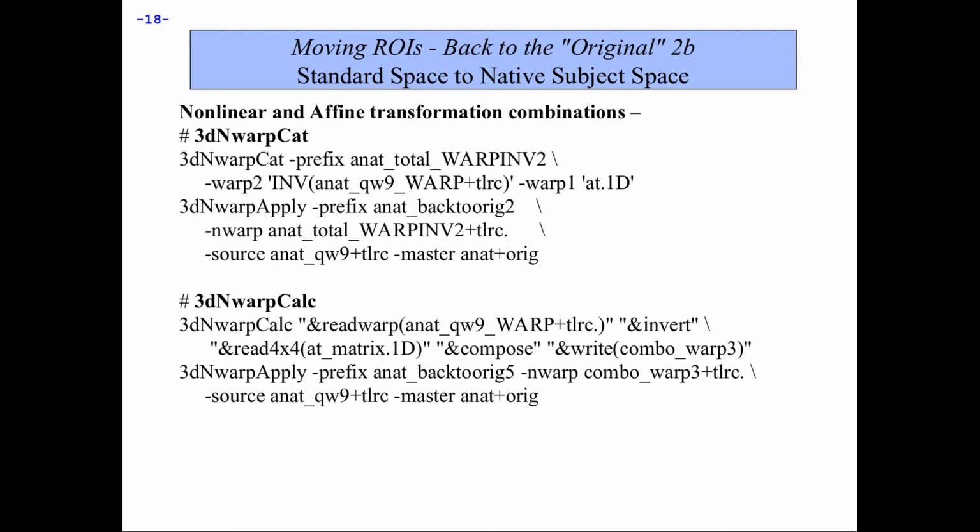Okay, there are a couple other ways that you can do it to generate these kinds of combined warps, with 3dNwarpCat or 3dNwarpCalc. We would generally do this with 3dNwarpApply.